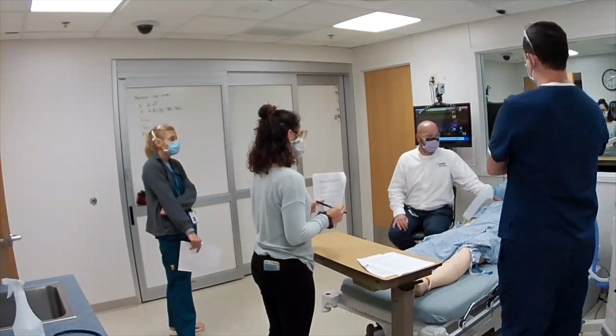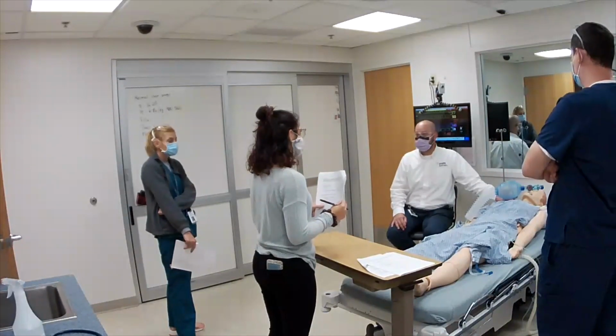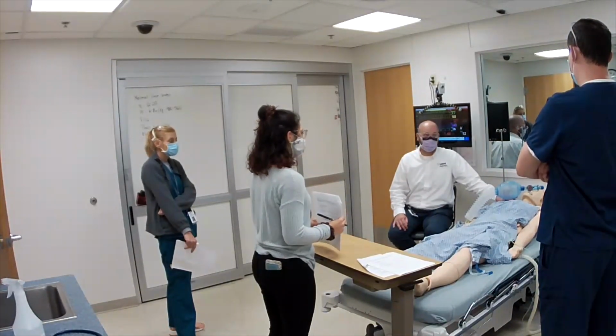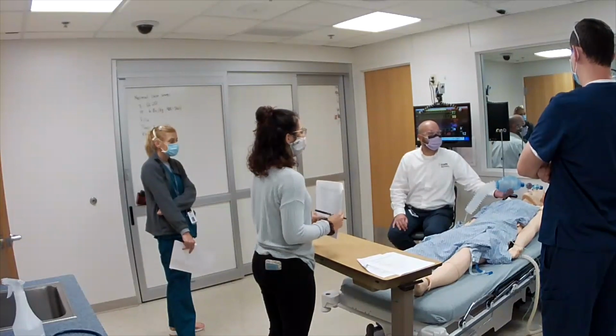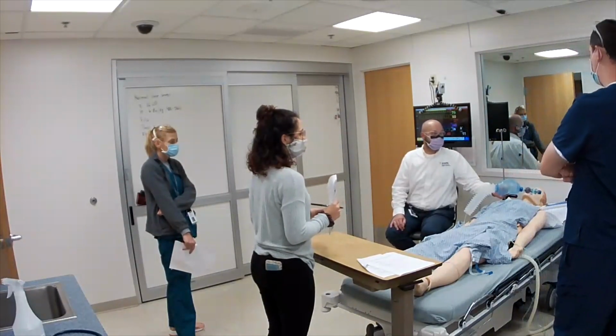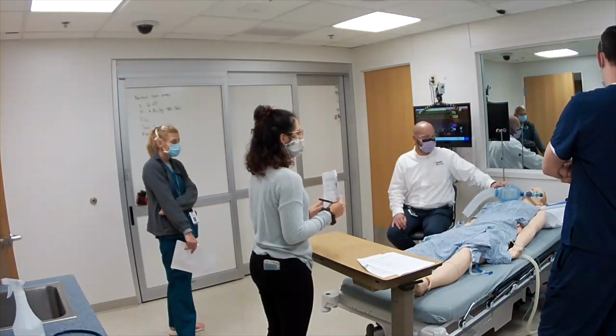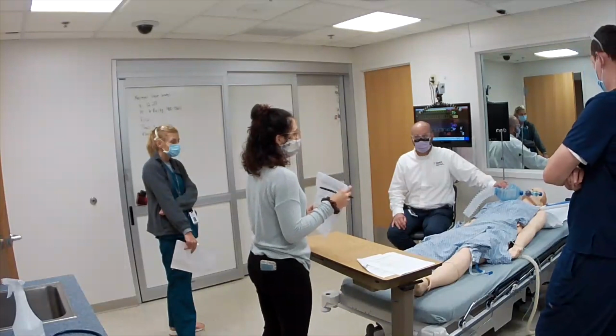Okay. What's the next one? Pressure support CPAP. Okay, so tell me about pressure support CPAP. It's good. Set PEEP, change pressure support to how much volume you want to achieve. The patient takes all the breaths. They're doing all the work. Yep. So this is our CPAP, and we can do this both invasively and non-invasively, right?